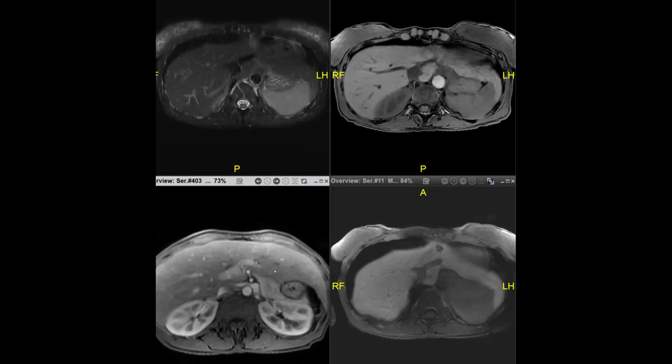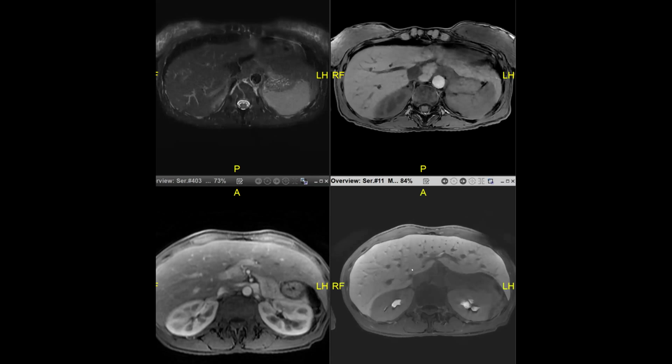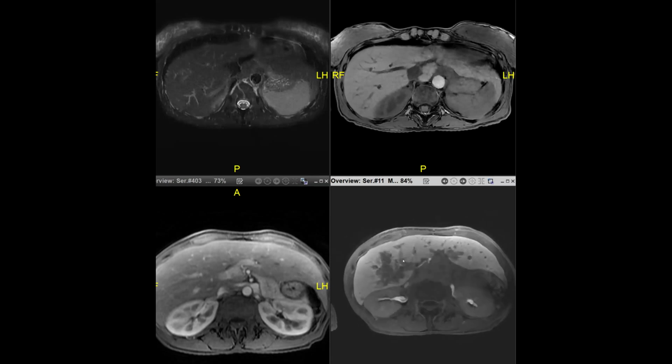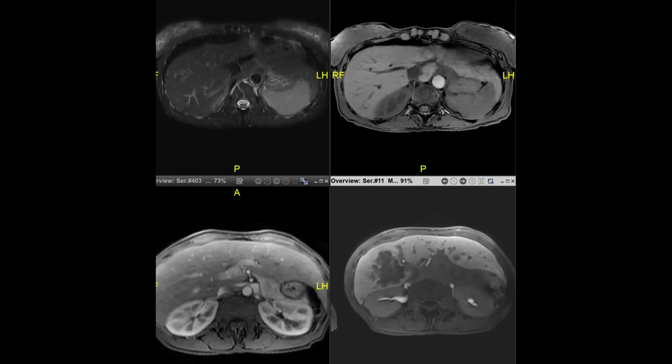But imagine if there was a little nodule here somewhere. That would be very difficult to pick up, even on ultrasound. So this is a better study to pick all of these up. And if they're doing very localized resection, this also needs to be known.